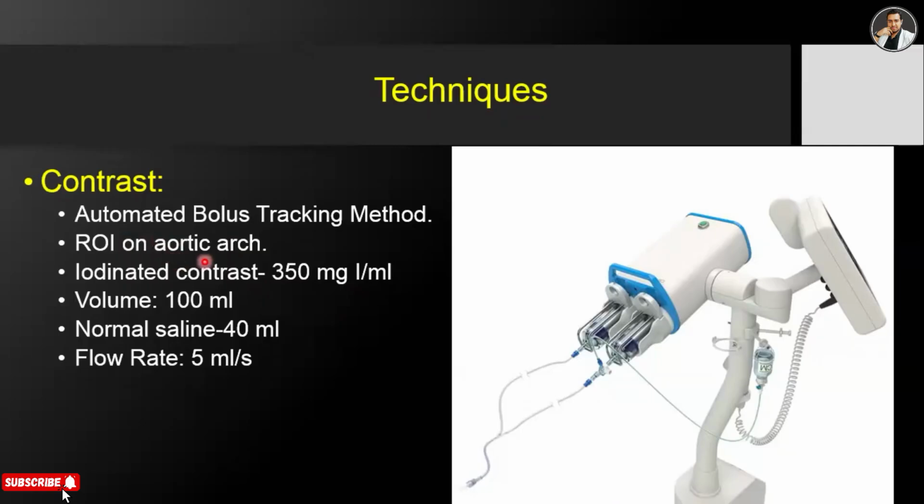But in this angiogram, we set the ROI on the aortic arch.